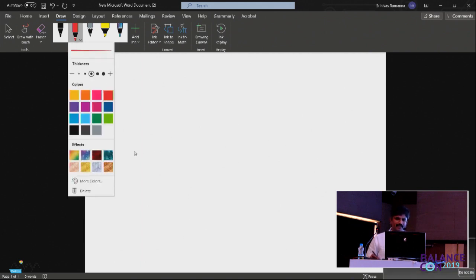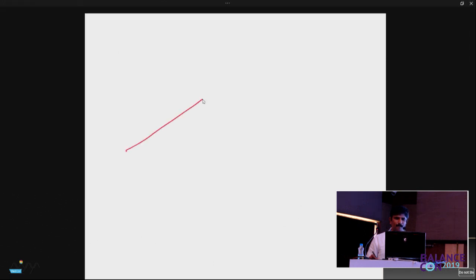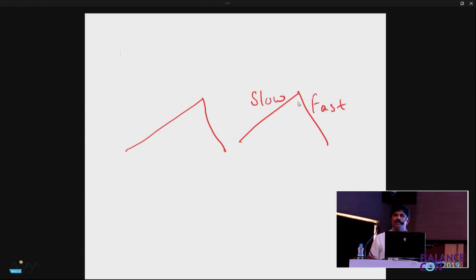First word, let us see. So the eye is moving. There are two segments here. Which alphabet is this compared to this one? This is slow. This is fast. So this eye is moving slowly in which direction? Fast in which direction? So which beating is this? If it keeps repeating, this becomes a left beating nystagmus.